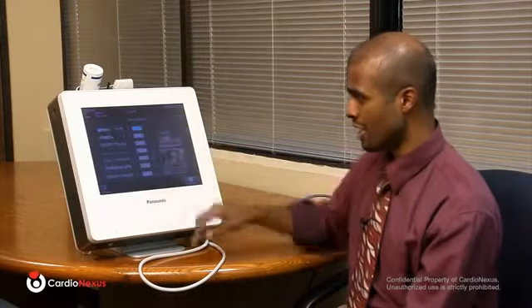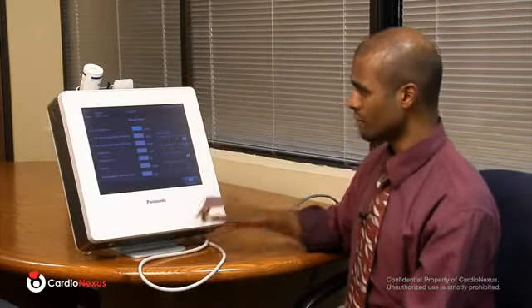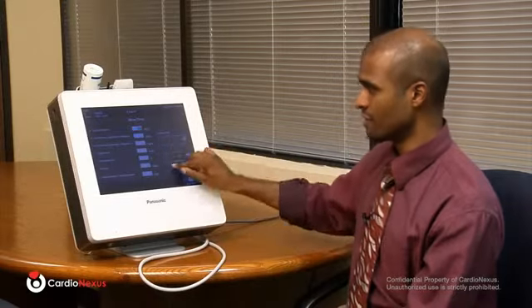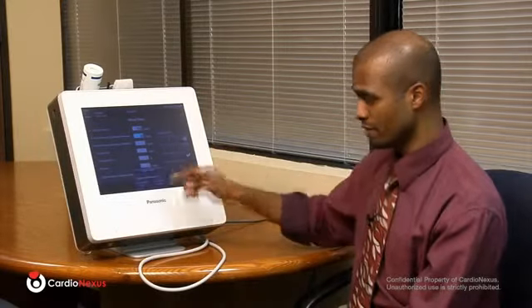Because we don't have that equipment here, I'm going to simply show you how you would manually type in the numbers, for example, for the blood work. So here's the cholesterol information, the total cholesterol. You can just use the number pad here to type in. I'll enter again some template information. Press Study Menu to go back to the main page, save that data, and then you'll notice a little check mark next to each application as you've completed it.